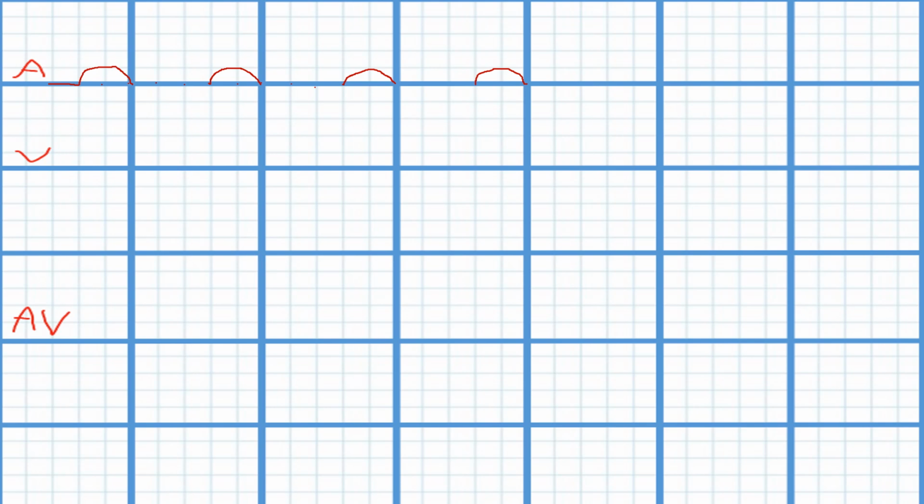All right. 2, 3, 4, 5. 1 up, 2 over. 1. I'm sorry, that's 3, 4, 5. 2 up, 1 over. All right. 3, 4, 5. 2 up, 1 over. All right, and I'm just going to connect these with baseline.